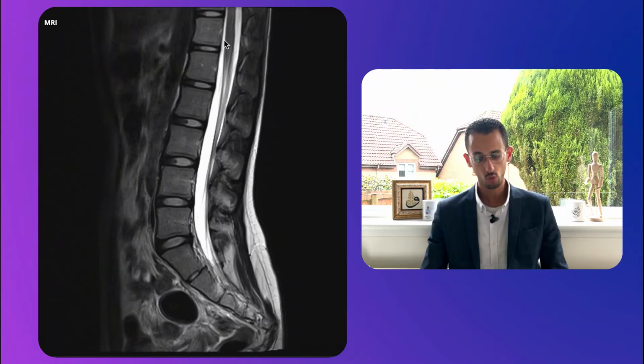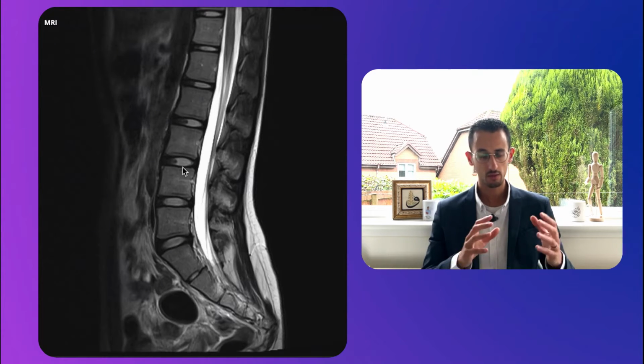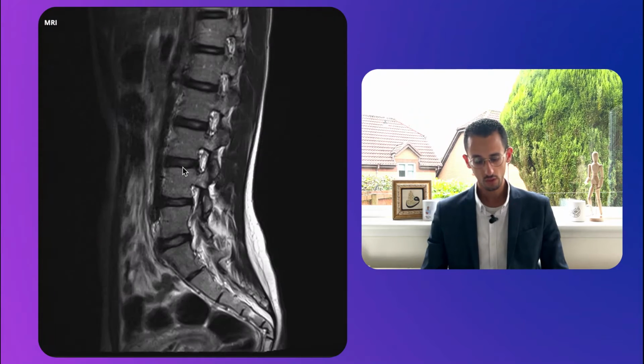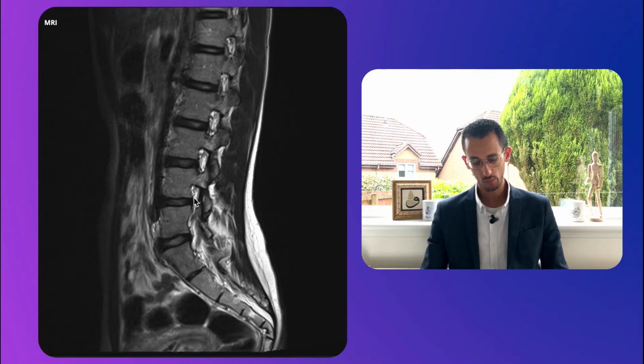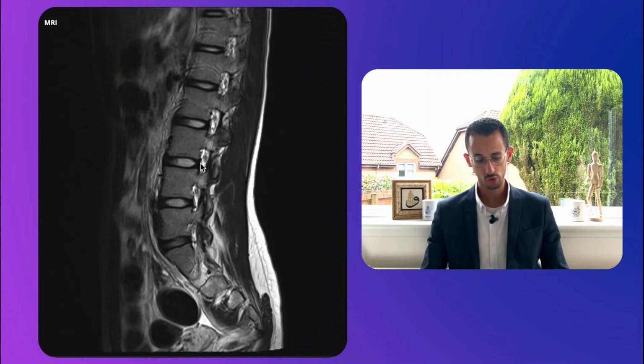Similarly, you can see the spinal cord or the conus medullaris much more clearly, and the cauda equina, which is the nerve roots, going all the way down through the thecal sac. We repeat the same process in the T2 image. We go to the sides to see this teardrop, where you can see the nerve root and the CSF surrounding it, and we move the image so that we can see the teardrop again. The nerve roots all look fine, so there is no foraminal pressure on the nerve roots. We go to the other side, and again the nerve roots look fine.